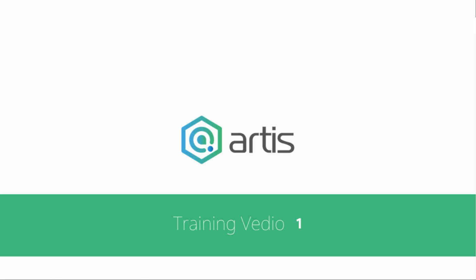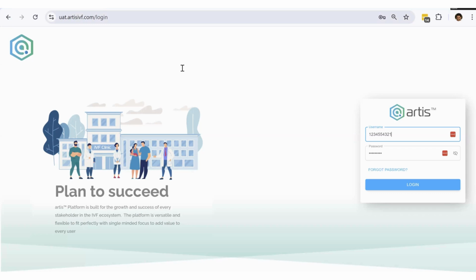We are going to cover the various features of ARTis IVF today in this session. So this is what the login screen of ARTis is. As you can see, this is a web-based application.